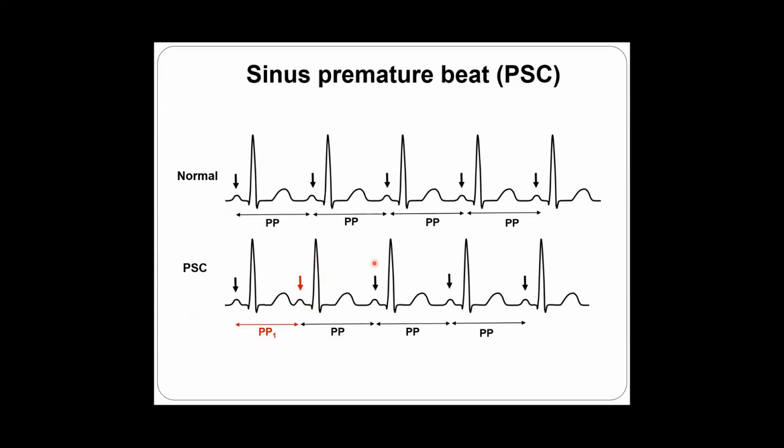And it's very, very important that this is right here. Okay, so it's very important because that is identical with this interval. Very, very important. This is how you diagnose: based on the shape of the P wave, and the following PP interval is identical with the normal PP interval. Okay, all right, let's continue.